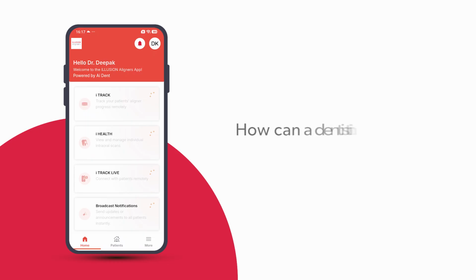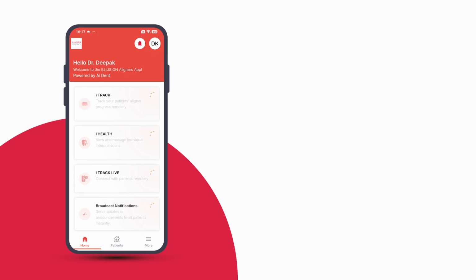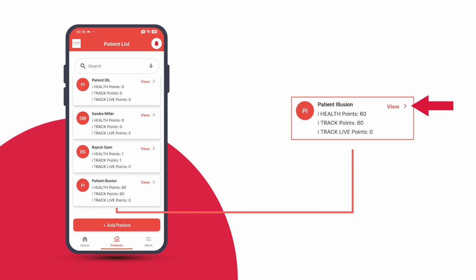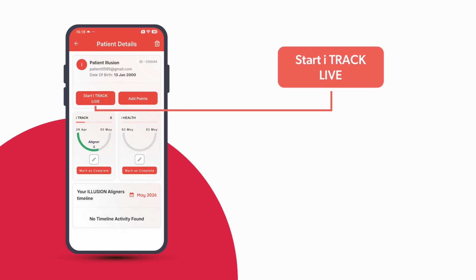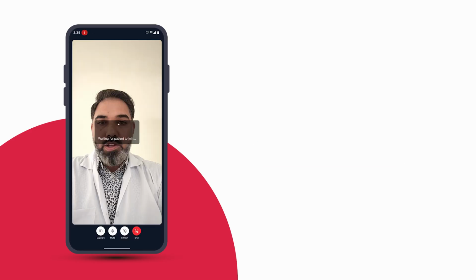Now, let's learn how a dentist can initiate a TrackLive session. So this is a dentist's account. Here, click on Patients. Click on View written ahead of your patient's name. Click on Start TrackLive. Click on Agree and Continue, and then directly start the call.